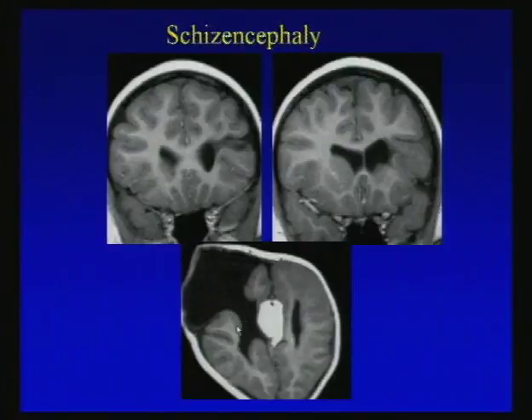Again, we see gray matter lining this cleft, and always look at the contralateral hemisphere, because you will frequently find abnormality on the other side. If we look at the left frontal lobe, there's also a very abnormal thickening and loss of that normal gray-white matter differentiation. The patient also had agenesis of the corpus callosum with an associated pericallosal lipoma.